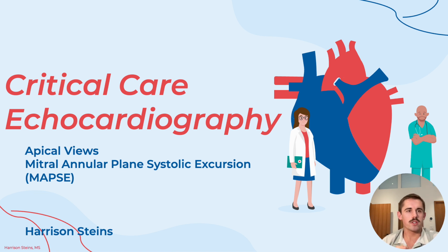Our clinical relevance for this topic today is that a symmetrical comparison of both ventricles and assessment of mitral and tricuspid valves, RV and LV ratio, can be important in a resource-limited setting when you don't have advanced echo tools or advanced continuous cardiac imaging or monitoring.